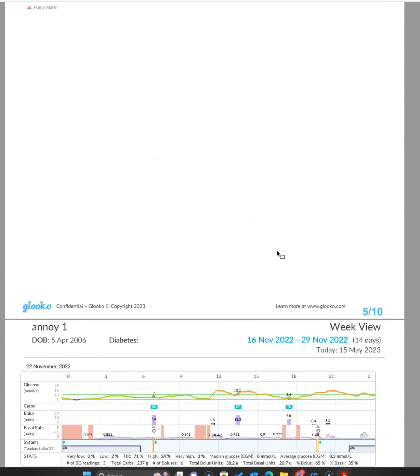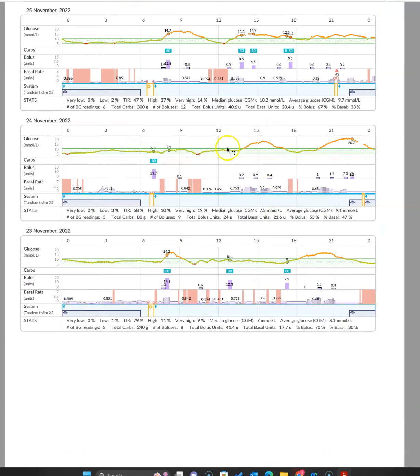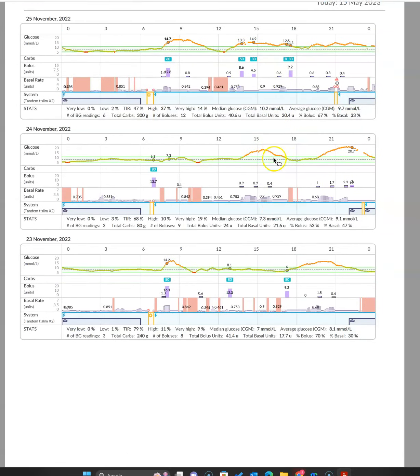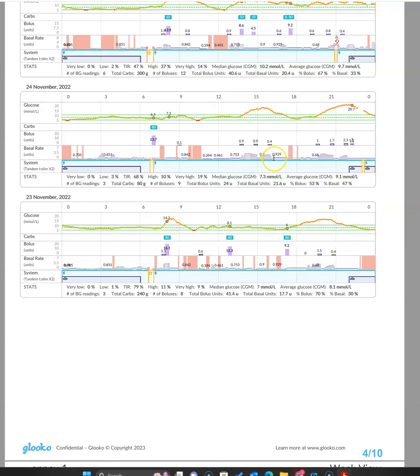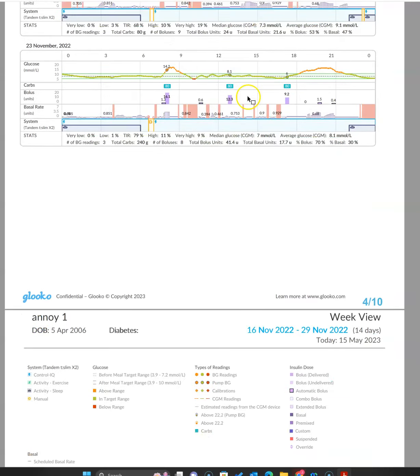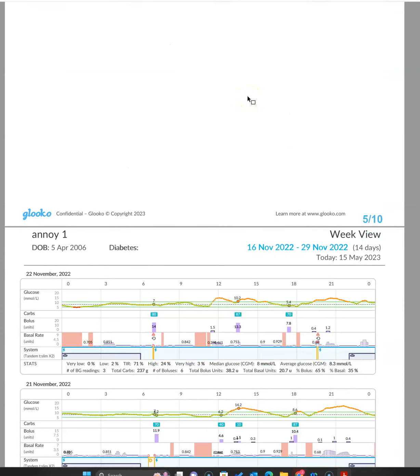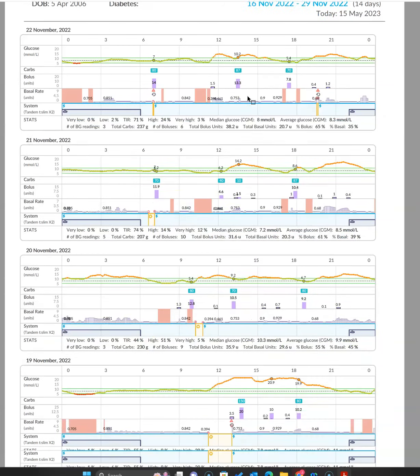And we'd certainly be having some conversation with regards to days where we've identified there's eating without insulin, such as this day here, no lunch, no evening meal entered, which is probably the reason why it's gone high. So there's some discussion to be had there. There may also be some discussion around insulin timings. Presumably there's also been some food before the insulin going in. So there's a couple of behavioural things to potentially consider depending on what the person discusses during the consultation.